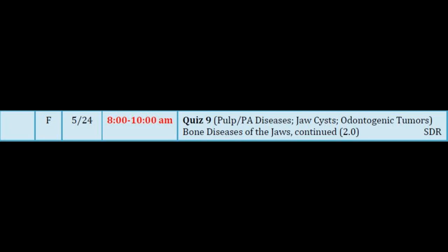Because it produces calcified material, it is an osteosarcoma. It produces osteoid that mineralizes. It produces density of lesion that's similar to bone, but doesn't have a normal trabecular pattern, and that can make it difficult to identify. But all of this is the osteosarcoma. And I bet you didn't even think about that as, oh, that's abnormal. So these can be very deceptive, which is totally ornery and not nice.